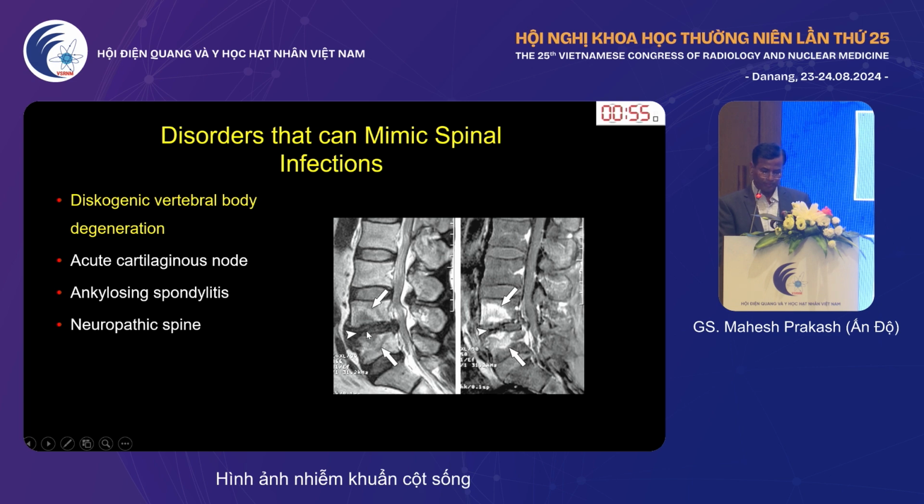So usually in the case of disc disease, you can see edema in the vertebrae or end plate, but usually the disc is hypointense. So it's desiccated, and not much fluid is there in the disc. So the infection is not there. So probably in these cases you are dealing with degenerative disc disease, not infection.